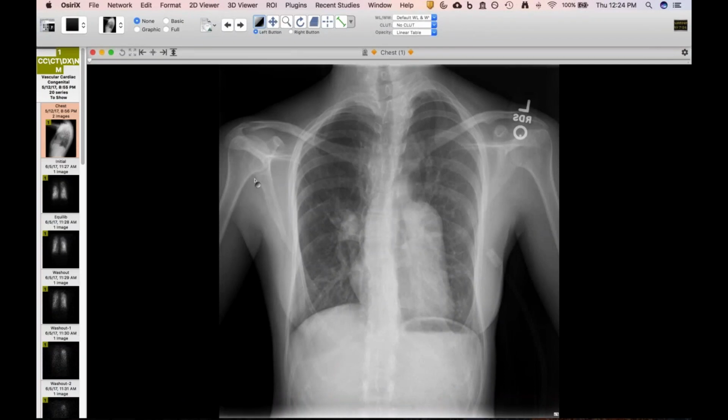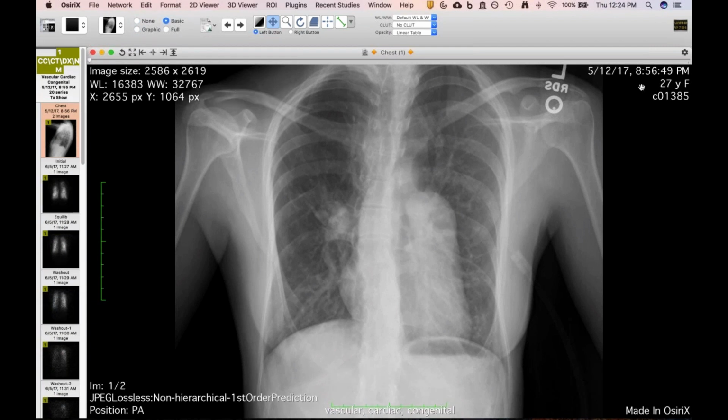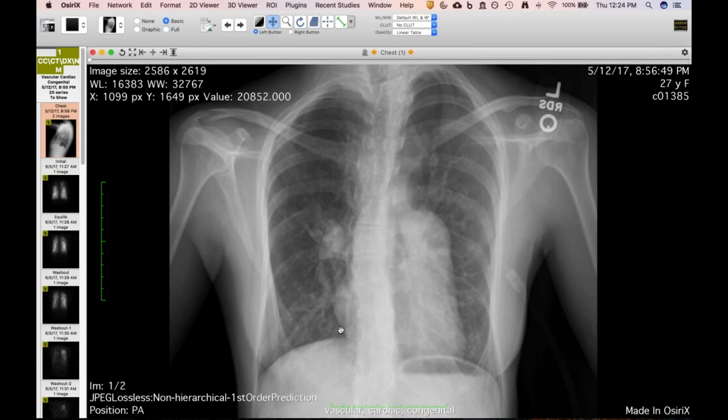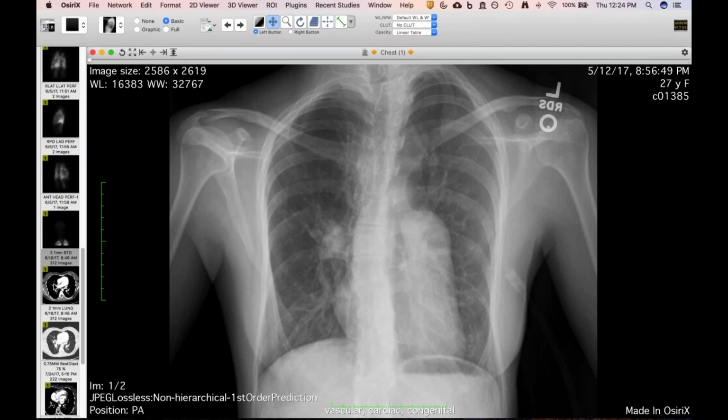Yeah. So this is an interesting case. I have not seen this in an adult of this age before, and I'll just give you a second to look at the radiograph. I think this lady is 27. Not from the United States, so not really access to any prenatal or childhood medical care. It's certainly an odd radiograph, and one of the things that jumps out is the pulmonary arteries look pretty large. The heart's very odd configuration here, and the aortic arch looks a little weird. But I'll show you the CT.